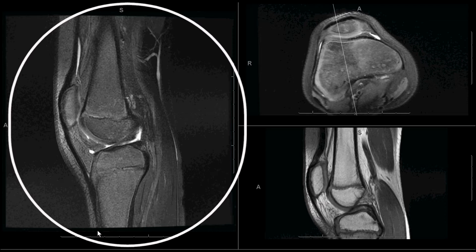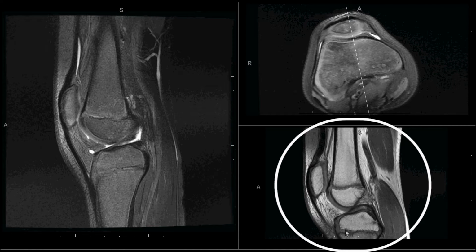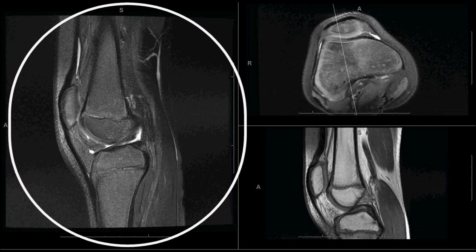This is the proton with fat sat again, and here we have it again on an axial view, and then for comparison, the sagittal proton without fat suppression. We see on this fluid-sensitive sequence that even a very tiny amount of fluid is going to be seen as bright. Where we look for fluid most often is the little suprapatellar bursa that sits underneath the quadriceps tendon and is bordered by a little pad of fat. This area will collect fluid, is most sensitive to physical examination, and is also accessible for joint tap if one needs to get a sample of the fluid.